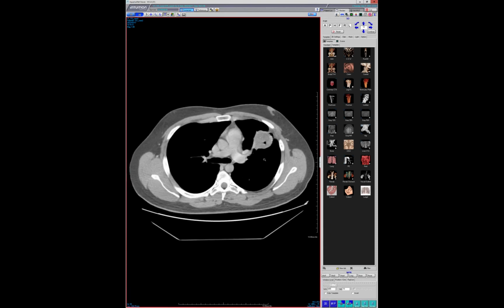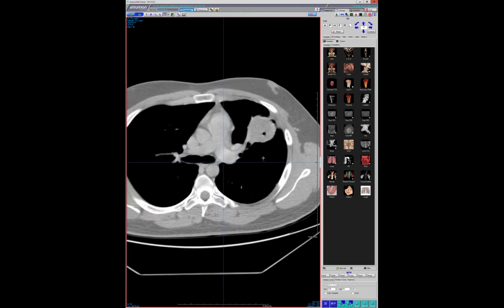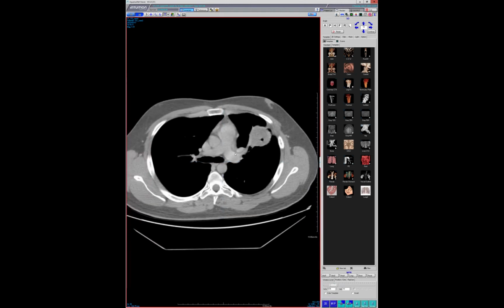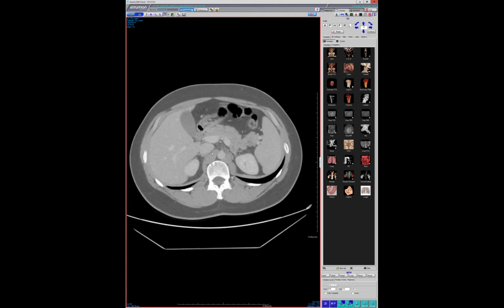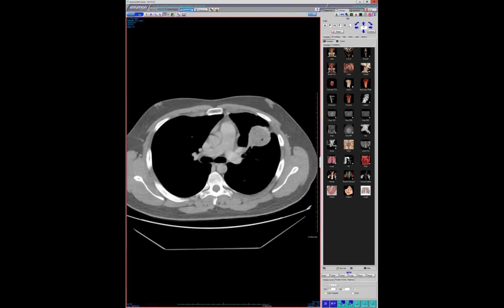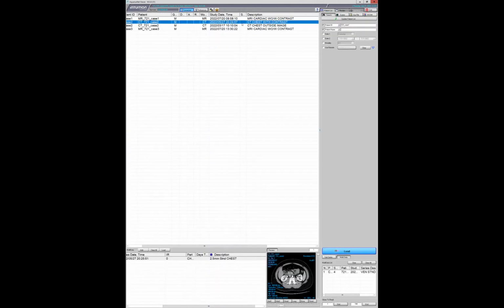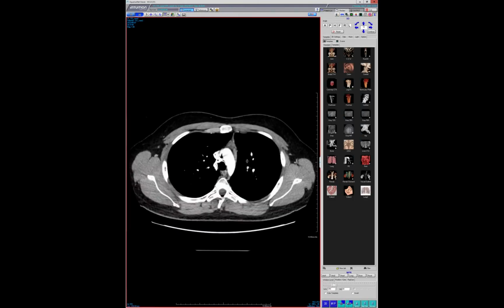It's one of these, there's a ball in the lung and it's unchanged over many years, and what kind of bug is it? This patient had this CT, unchanged, and they actually knew the diagnosis. I think someone had biopsied it in the past. There's nothing in the liver, which is the one thing that may clue you into the diagnosis. And it's just a necrotic cyst-like thing with a couple of bubbles of air. I'm guessing the bubbles of air had been there for many, many studies, so I'm guessing it formed a little fistula with one of the airways.